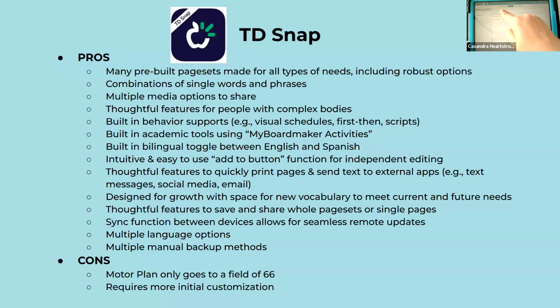So page set, let's see if I have it. Let's just do this, create. Now I have this really easy toggle between English and Spanish. TD Snap definitely makes it the easiest to toggle between English and Spanish.